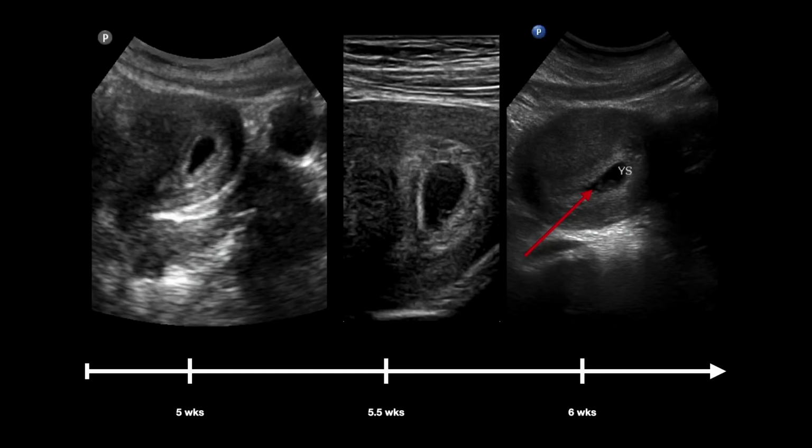So generally, at about week 5, you start seeing the developmental formation of a gestational sac, right? That sac within the uterus that indicates this is where the pregnancy is going to happen, right? Really, in my experience and according to the literature, this generally happens around 5 weeks. Generally, you don't see it earlier than that, and generally you see it farther along, right?